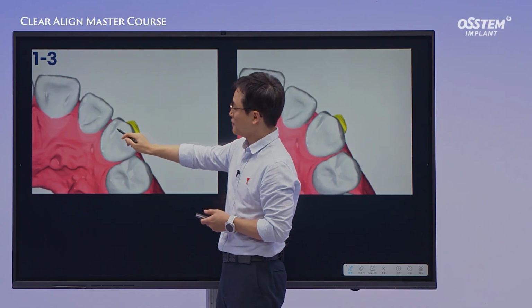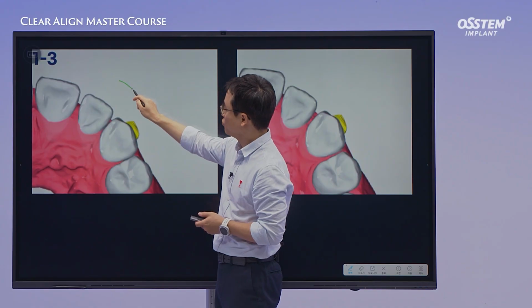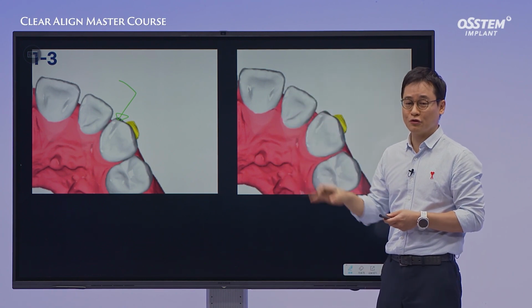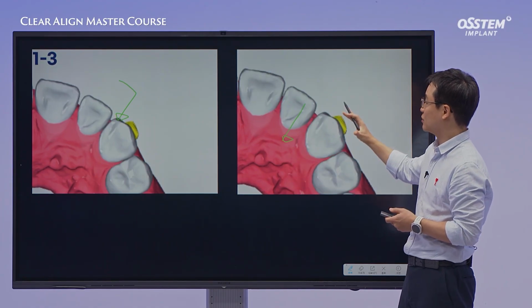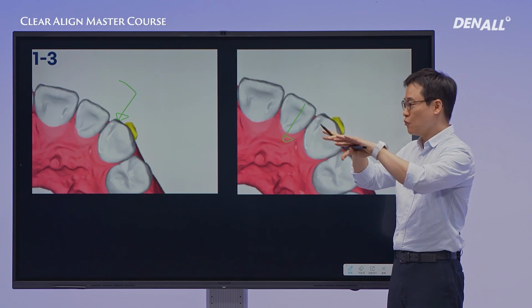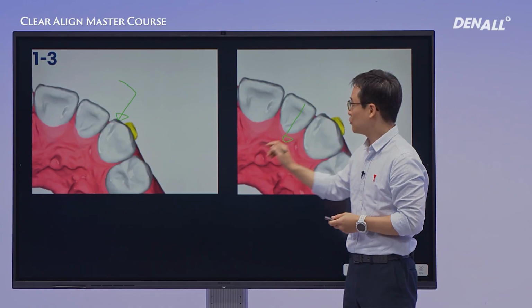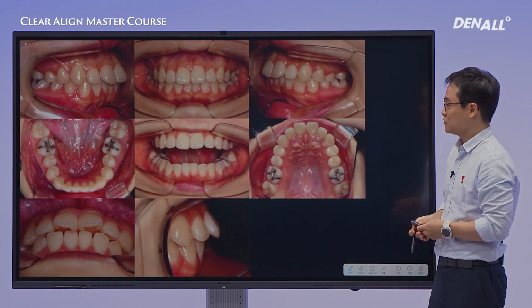Focus on this tooth here. Looking at the movement of the lateral incisor, this tooth first moves distally and then lingually. These movements represent an inefficient pattern of movement, as ideally they should be retracted lingually. These issues require correction. When retracting protruded teeth, we often first shift them distally and then turn them inward in an L-shaped path. Instead, it's ideal to move the teeth directly inward. These points must be commented on to ensure proper treatment progress.